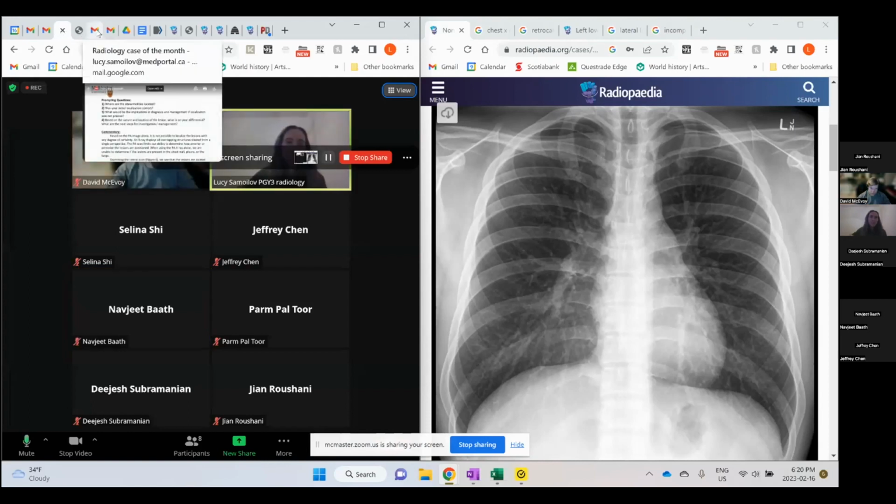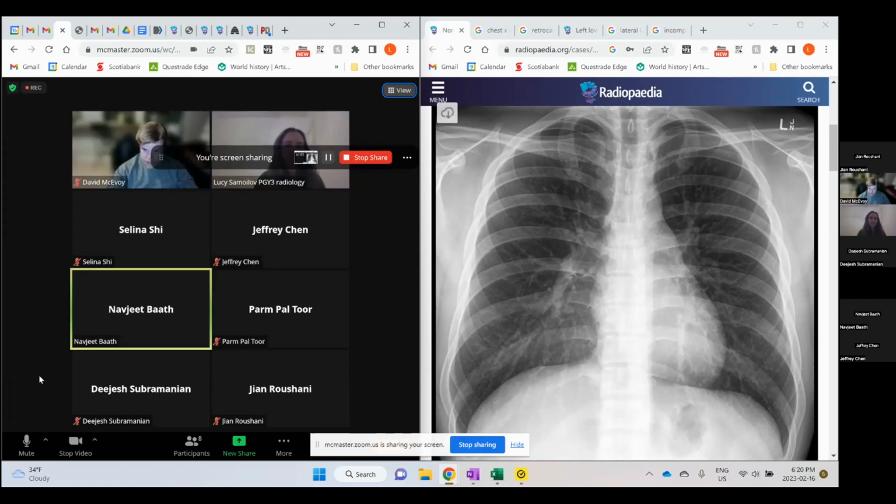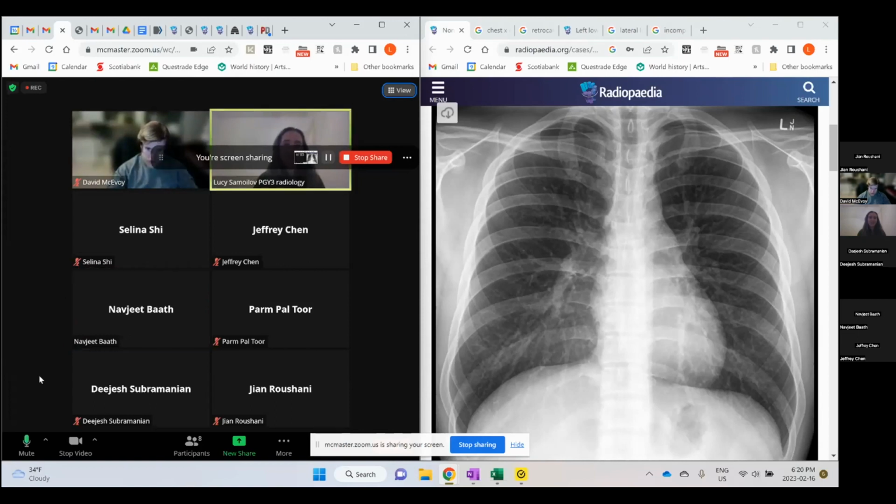So what is on your differential diagnosis? Somebody else answer this question. I think the only pleural related opacity thing I remember is mesothelioma. Okay, maybe. Yeah, very nice.